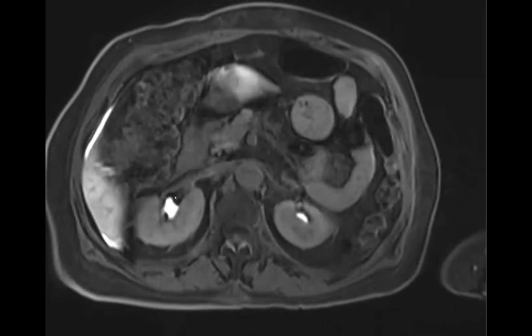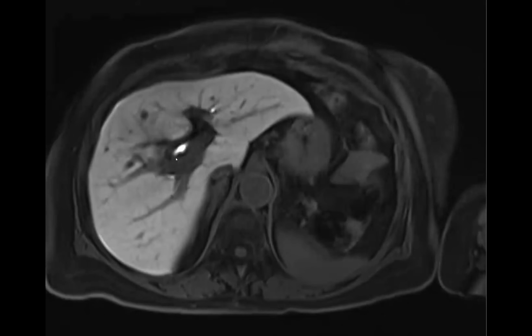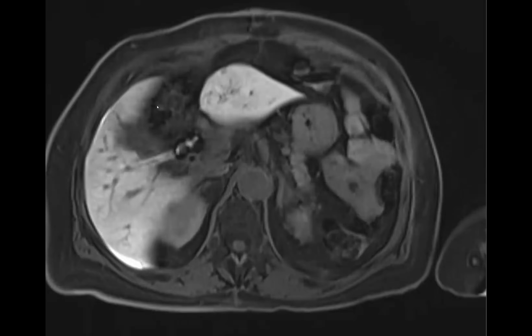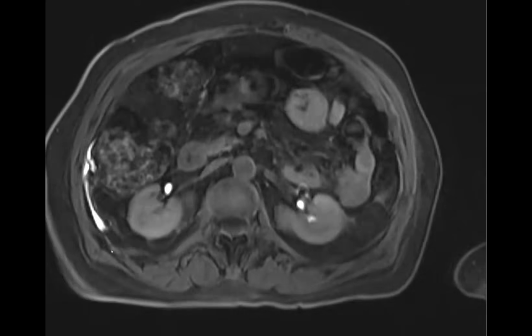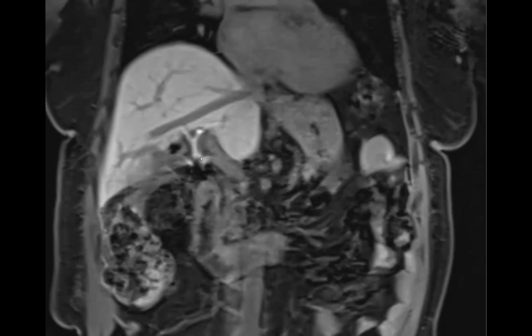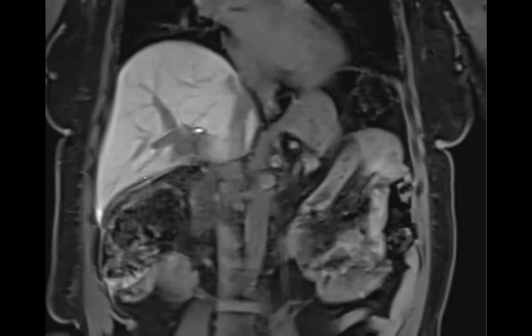So basically it was an 80% transection of the common bile duct. And a biloma was not collecting because it was mostly being drained off by this large surgical drain. There was a little bit in this fluid here. I'm just going to show you the coronal. Basically here it was below the confluence. It was 80% transected, which is why I think it wasn't backing up. It wasn't like the bile ducts were completely obstructed, but it was mostly leaking and then tracking out into this drain.